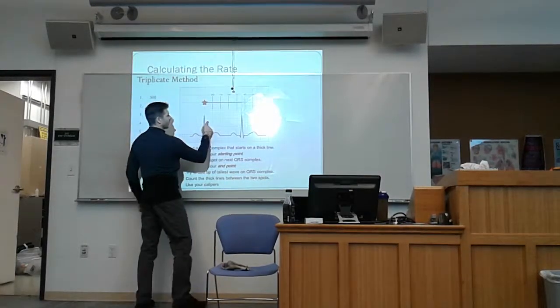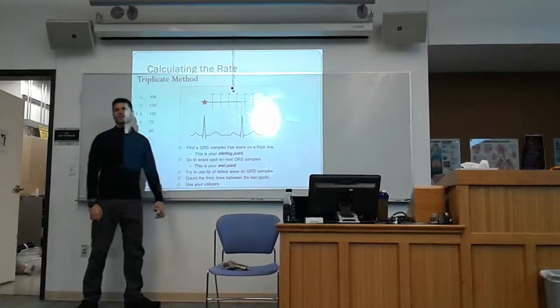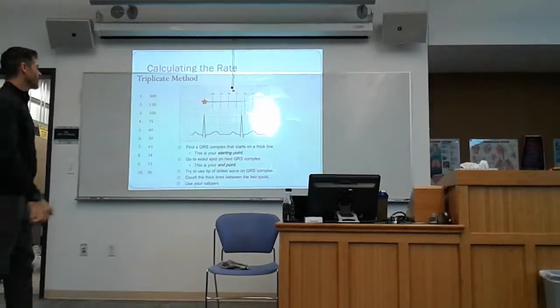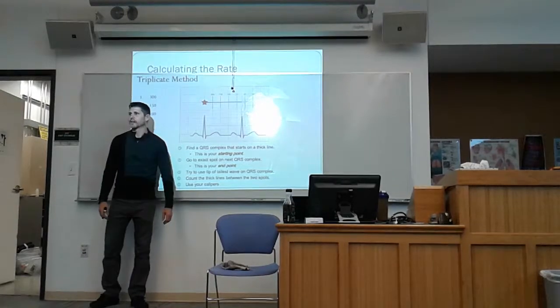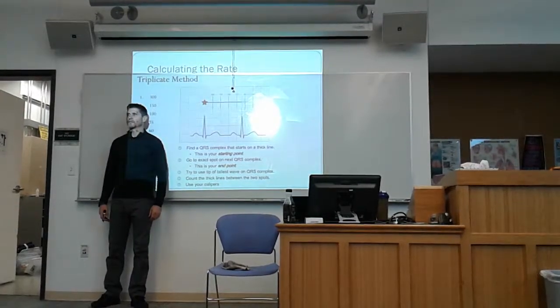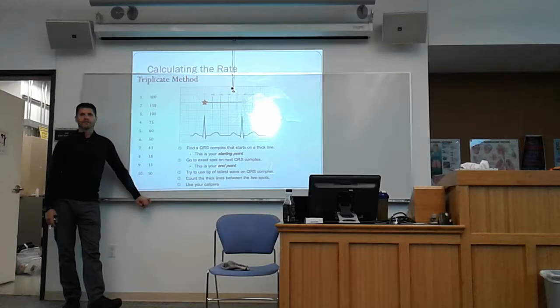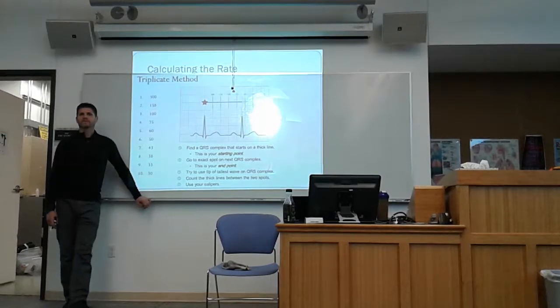So here we have 5, 10, 15, 20, 21, 22, 23. So we have 23. What's 1,500 divided by 23? Someone do the math. It's probably somewhere around 66, 67? I think it's rounded like 67 here. Right? Wait for it. No one wants to be accurate. 65.22. Great, so it's right around 65, 66. Great, perfect.